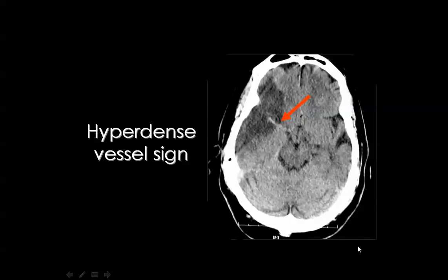And the infarction is usually the result of arterial thrombosis or embolism, and the artery is occluded, and the occlusion will appear exactly like the hematoma, hyperdense in the CT like this. This hyperdensity is present in the middle cerebral artery corresponding to this infarcted area, and this is what we call the hyperdense vessel sign. A hyperdense vessel sign means that the middle cerebral or any one of the major vessels is thrombosed, showing a hyperdense course, indicating that the area supplied by this artery is infarcted.